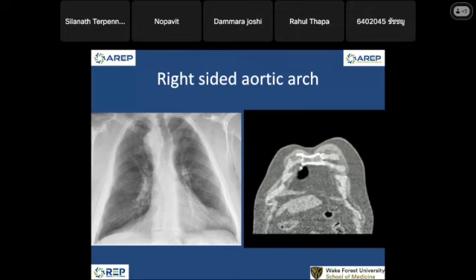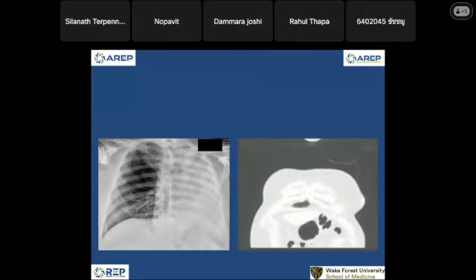Are we okay? Yes. Okay, all right, next one. I'm not telling you anything. We just have this chest radiograph and then the CT of the same patient. I have the patient information hidden here. Okay. So is the chest radiograph normal? No, it's not. Okay, let's do it one by one.